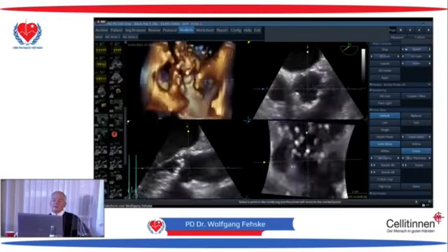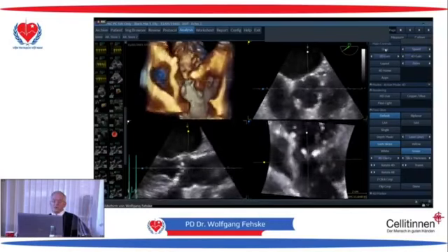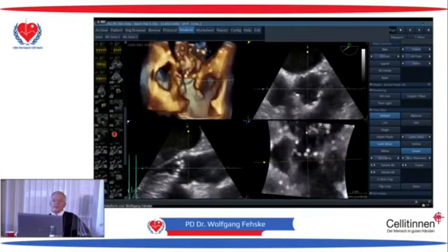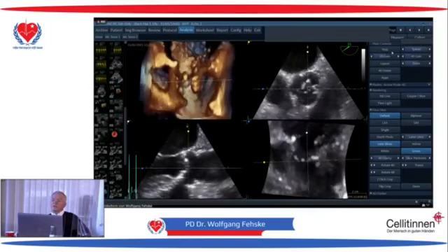But there is another point in this specific patient. Can you please first of all explain it, and then I will show you another interesting part in that patient here.